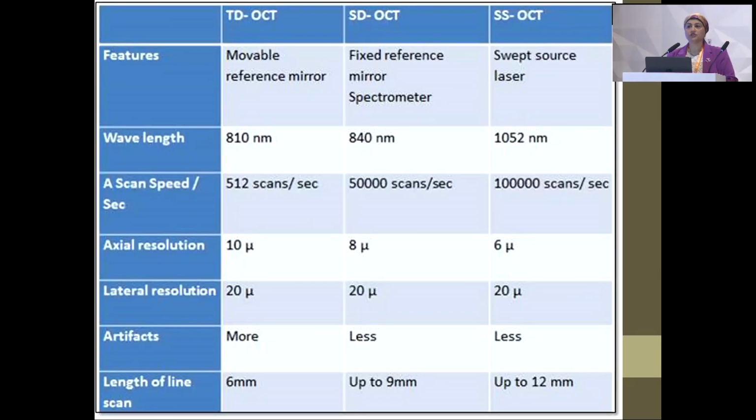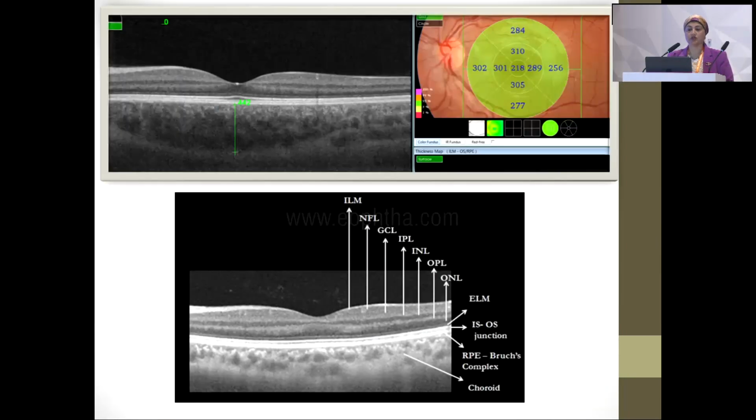To talk about OCT biomarkers in DME, this gives me the chance to introduce how the technology in OCT has advanced, as we all know, from the time domain to the swept source OCT with its high resolution. It gave us the advent of the real histological picture of the retina, and this is the recent high definition, high resolution picture that we all see in the OCT.